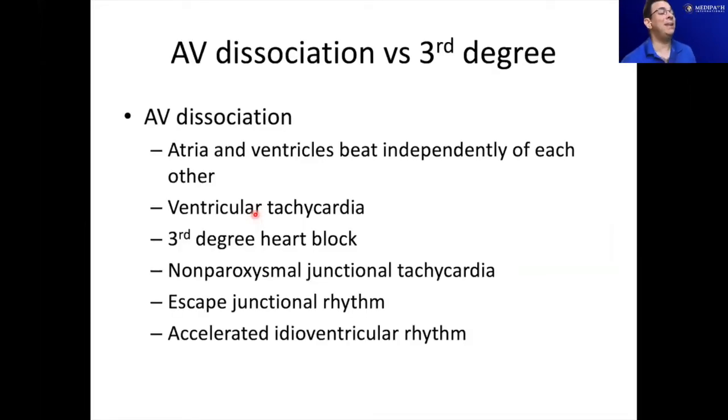Sometimes you'll hear the term AV dissociation and third degree block used interchangeably. They are slightly different. Third degree block is a subset of AV dissociation. There are other causes of AV dissociation; junctional escape rhythms and ventricular tachycardia are a few examples of those.